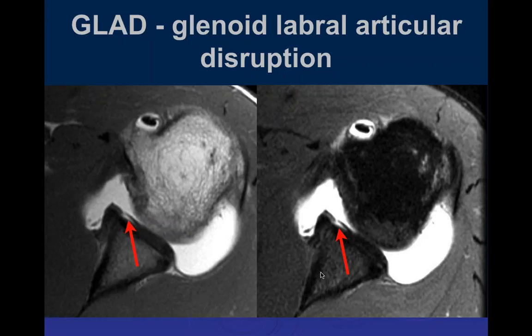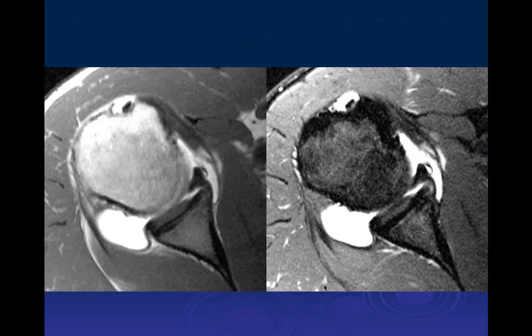The way I would think it would. You think it's a bony fracture or just a cartilage fracture? A cartilage fracture. Okay. But there is a little bone to it. I think some bone went with it, a sliver of bone. I don't know. And I can't say, John. You're the radiologist.